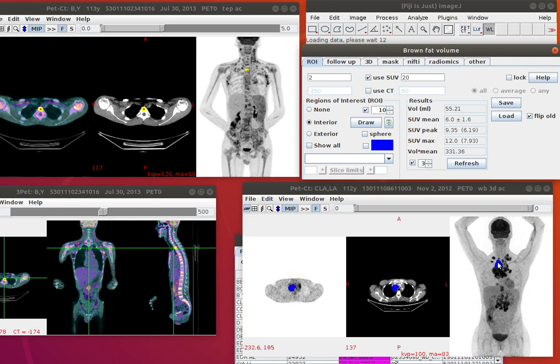Okay, this is the same organ here as here. We make believe at least. Okay, now I would like to go back. Since the blue dots are showing here, I'd like to go back and see these again.